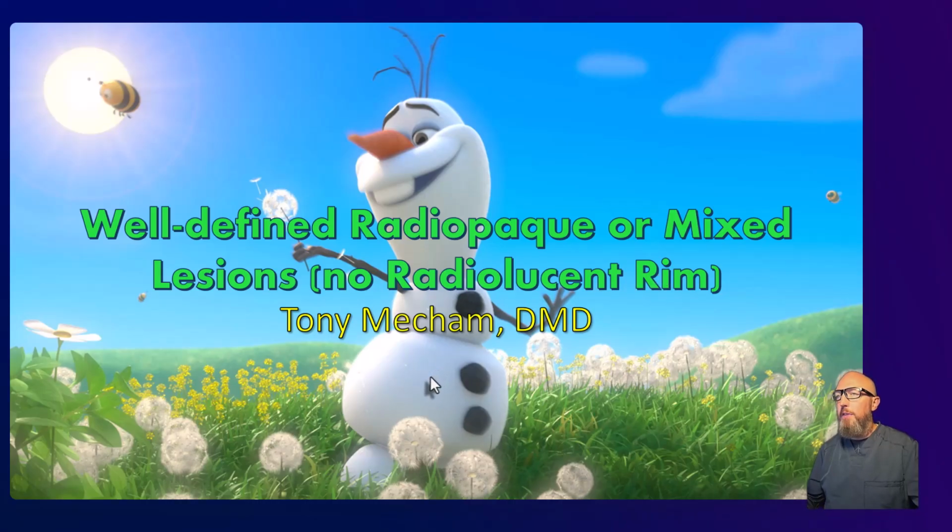And seeing Olaf in the background here dancing around in the sun, that's doing double duty. These lesions are opaque, so bright. They're also benign, happy to just sit there, no treatment at all for the most part. Two exceptions will flag: condensing osteitis, which hopefully you already know how to handle, and extensive fibrous dysplasia. Otherwise, these lesions are all just leave them alone.